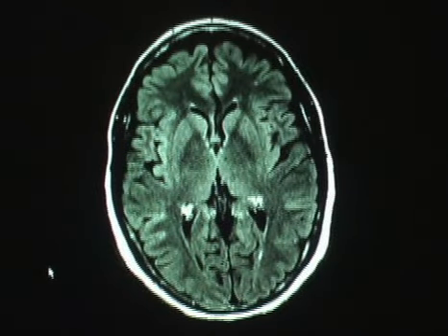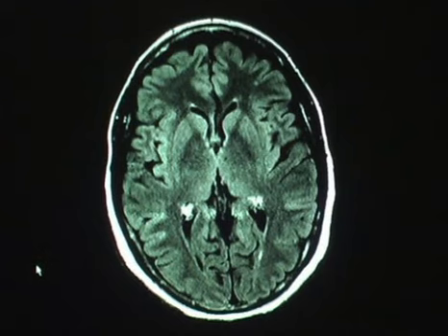This is a patient who had been evaluated by their neurologist for chronic fatigue syndrome, fibromyalgia, issues of chronic pain. What we noticed on this patient was that there was a small white matter lesion. As you can imagine, this is somewhat nonspecific. We might have said this was mild microvascular disease. We could have even said this was a small focus of demyelination, almost just an unidentified bright object.